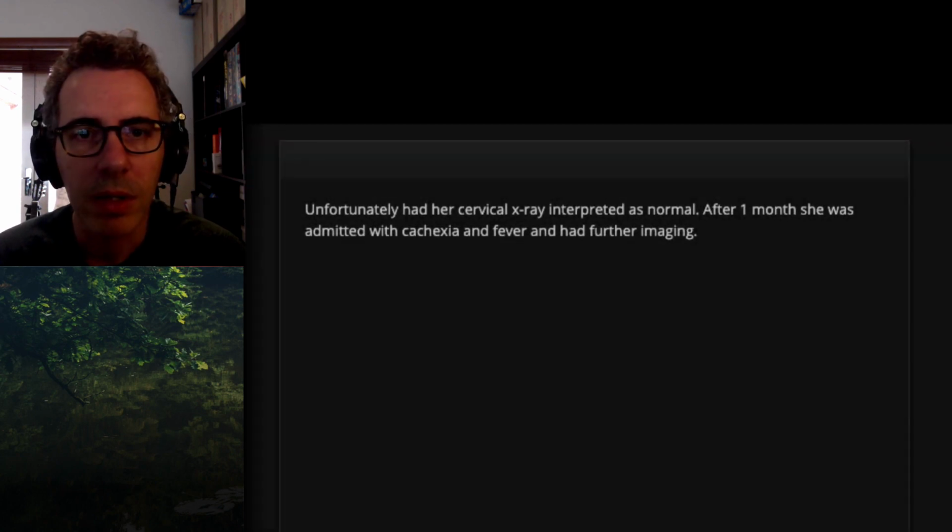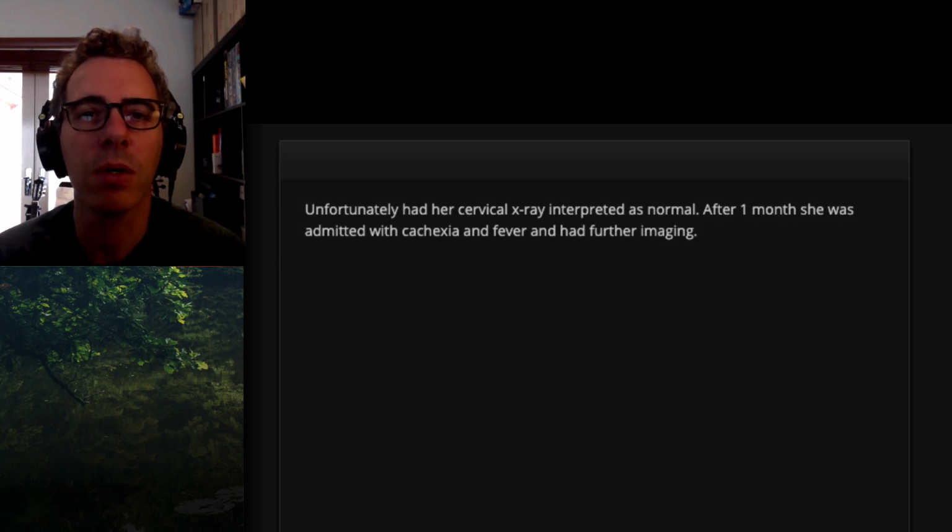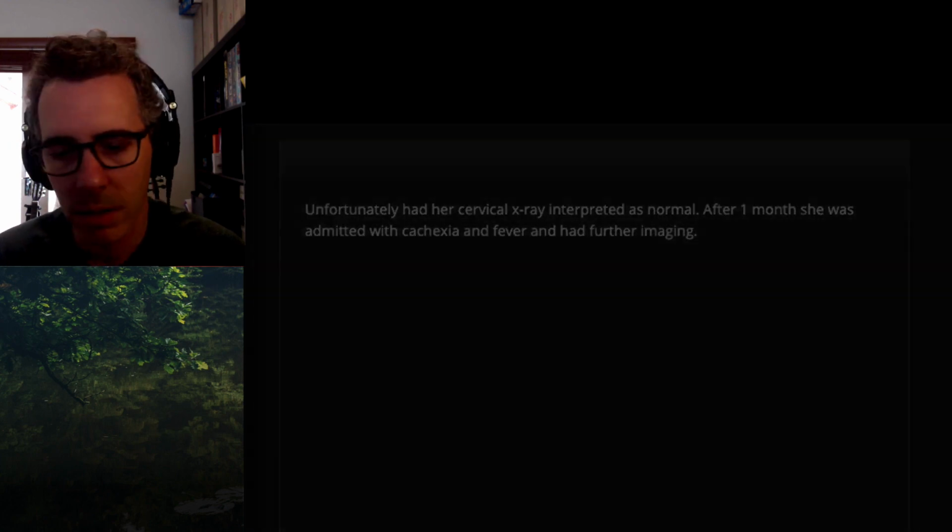Oh, so this one maybe is the one that I'm thinking of, because this was interpreted as normal. The MR is a month later. Okay.